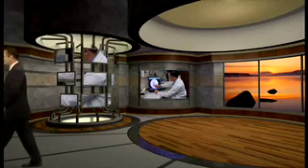As Dr. Ulanski illustrated, the EyeRoute image management system proved very useful in helping with patient flow, improving efficiency, reducing time in finding and refiling clinical photos, and creating new charts, all of which translate to cost savings. Patients benefit too, because EyeRoute provides easy access to patient information, including ultrasound, OCTs, and clinical photos in one quick search. Patients can immediately see results as you explain a condition, such as a macular hole.